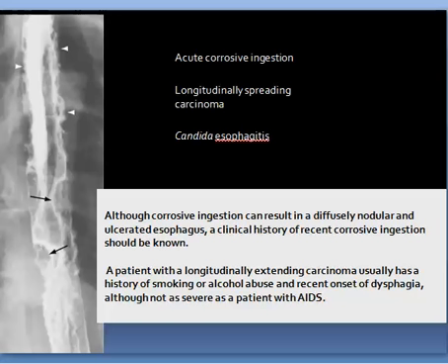this patient with thick irregular esophageal mucosa, but there should be a history for corrosion. If you exclude corrosion in such case, this is appearance of again varicoid pattern of carcinoma, or sometimes it is Candida esophagitis which can produce such an appearance.